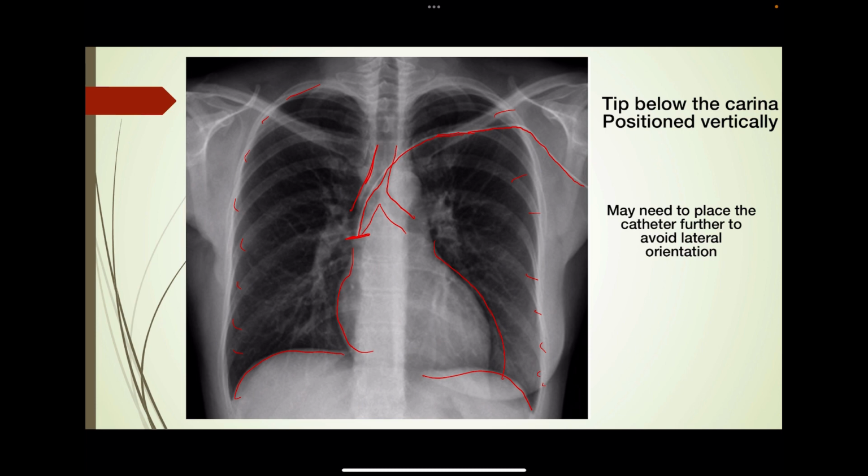You want to make sure that the catheter is vertical and not coming in up against the vessel wall, which could cause complications. If it's long-term, down a little bit deeper, cavo-atrial junction would be appropriate. But I'm perfectly happy with that placement, which again is right here.